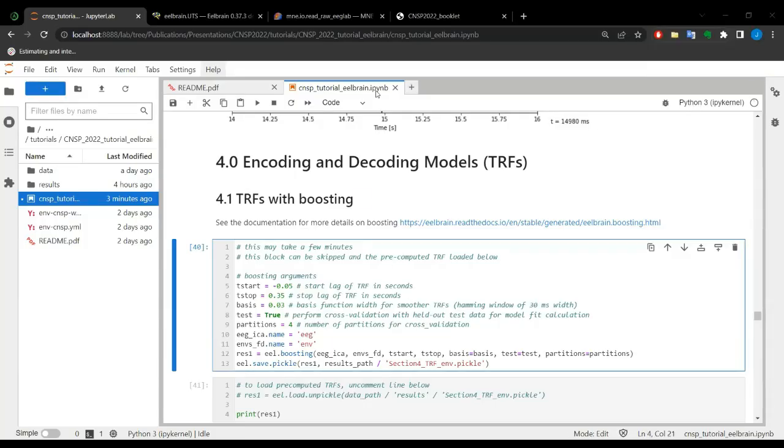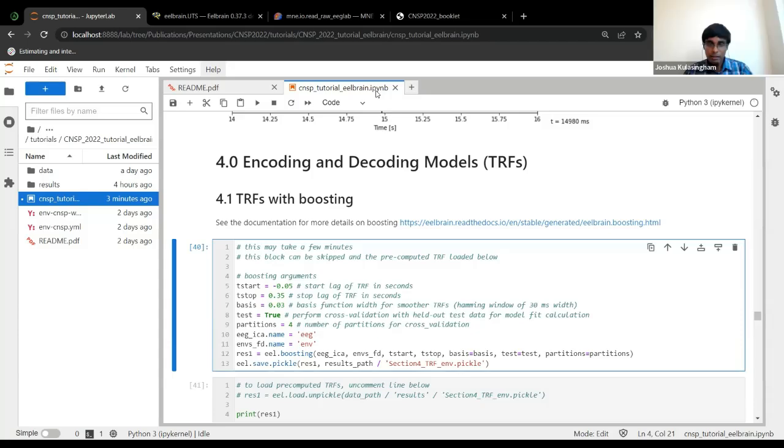Yeah, here we did concatenate across trials, but even when you concatenate across trials, it's going to throw an error if you have some trials with more sensors. Actually, you can't make an NDVar with differing numbers of sensors for each trial. So you would have to have the same number of sensors for each trial if you want to make it into one NDVar, but you can always run each sensor separately in a different NDVar. Then you don't care about mismatching trials.